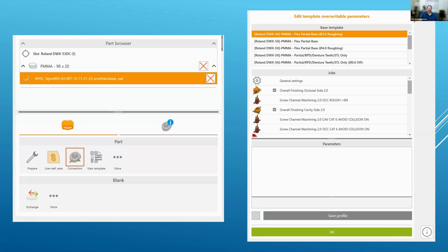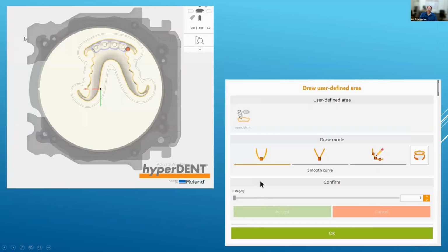it saves you 5 or 10 minutes maybe on your milling job, but the offset you have to create takes up a lot of room in the puck. And we all have to be concerned with costs, and being able to fit 2 partials for sure in 1 puck is definitely a huge advantage over maybe saving 5 or 10 minutes of milling time, but only being able to fit 1 partial in a puck because the offset's so big. And I'll show you what that means in a little bit. So that's really the only difference as you move forward with this in your software.